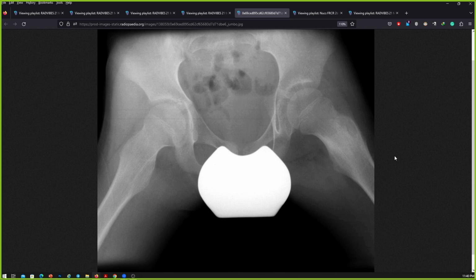Where could you point it out for us? On the left, there is some widening of the left epiphysis. Yes, candidate 1, could you please point it out with your cursor? Yeah, there is some epiphyseal widening on the left side. Are you sure about it? If you compare it to the right side, does it look widened? So, yeah, it looks similar.